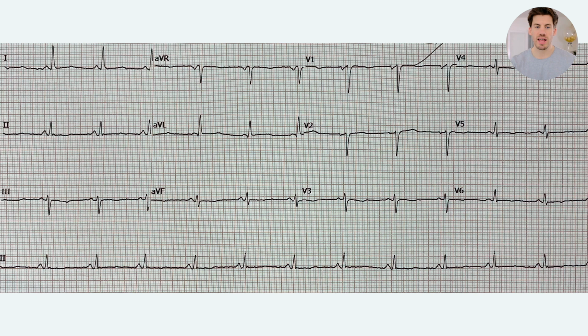So let's put that into practice. Here we've got a 12-lead ECG. What is the cardiac axis on this ECG? Using those principles, immediately your eyes should shift straight away to leads 1, 2, and 3, because that's where the money is. That's where we're going to work out the axis. And then we want to work out the average deflection of each of those leads, and using the 3 of them together, work out whether it's normal, left, or right.